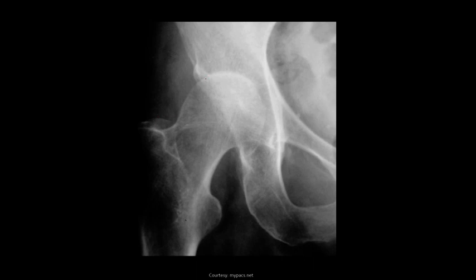It's supposed to articulate with the acetabulum. Where's the acetabulum? There is no acetabulum in this case, or there's no joint space in this case. We've lost Kohler's teardrop. So we're losing that superior, the roof of the acetabulum. Like, where is it? We're losing the medial aspect of the acetabulum. So that's that loss of the subchondral white line, as well as loss of the joint space. Classic septic arthritis changes.